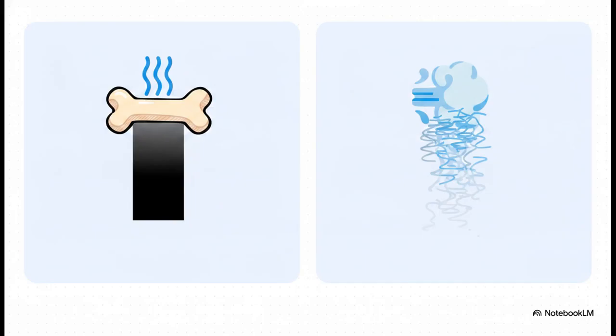Now, we need to be really precise when we're looking at shadows, because they actually come in two distinct variations that offer a totally critical diagnostic difference. We've got clean shadowing versus dirty shadowing. A clean shadow happens when the beam hits a hyper-attenuating interface. Think bone, calculi, or compact material, like maybe a foam earplug. It absorbs the beam, creating this crisp, dark anechoic zone right below it.